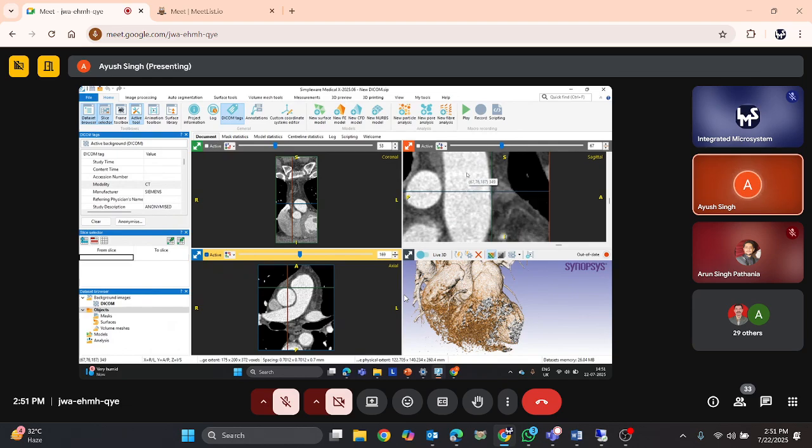How to do that? When we hover on any point in any of the 2D views, you will see that I am getting four values. The four values basically correspond to the x coordinate, followed by the y coordinate, then the z coordinate. And over the pattern section, the fourth value corresponds to the grayscale value at the point that you are working on.